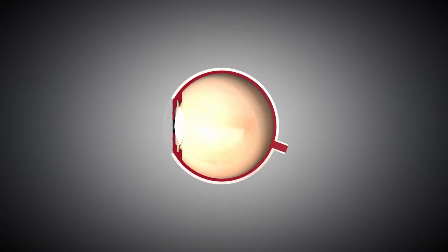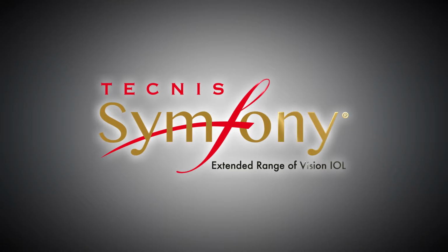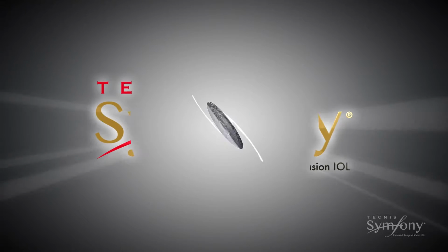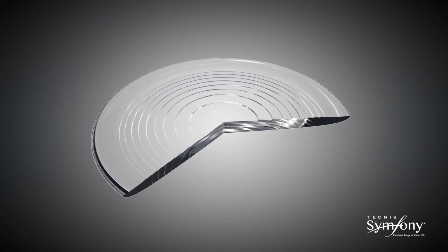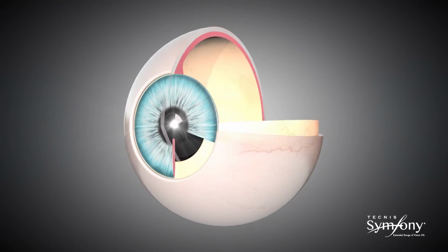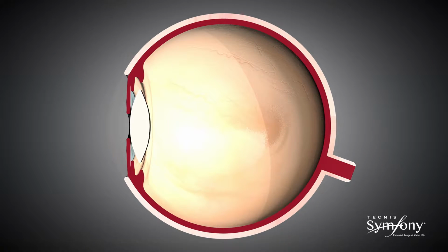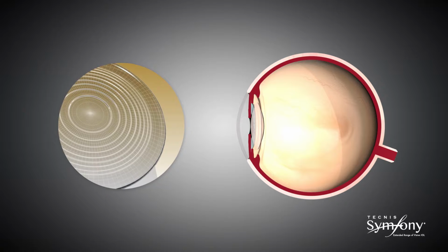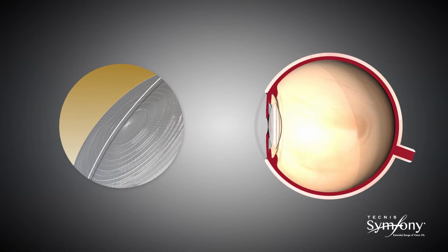Now, with the introduction of Tecnis Symfony Extended Range of Vision IOL, a new category of presbyopia-correcting IOLs is available for patients. Tecnis Symfony IOL is the first and only presbyopia-correcting IOL that provides an extended depth of focus, which results in an extended range of continuous, high-quality vision with enhanced image contrast, as well as low levels of visual disturbances. Tecnis Symfony IOL delivers on this promise by utilizing two proprietary complementary enabling technologies, which are the echelette design that extends the depth of focus and the achromatic technology which corrects chromatic aberration.